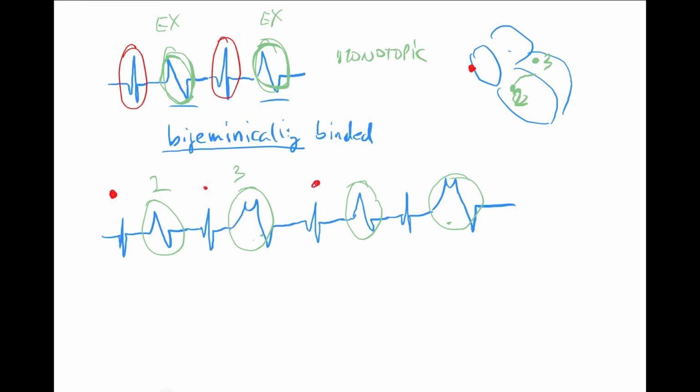So this is bigeminally bound, and plus it's polytopic. There are two places. And you can talk about atrial or ventricular extrasystoles, it doesn't matter. It's the same.